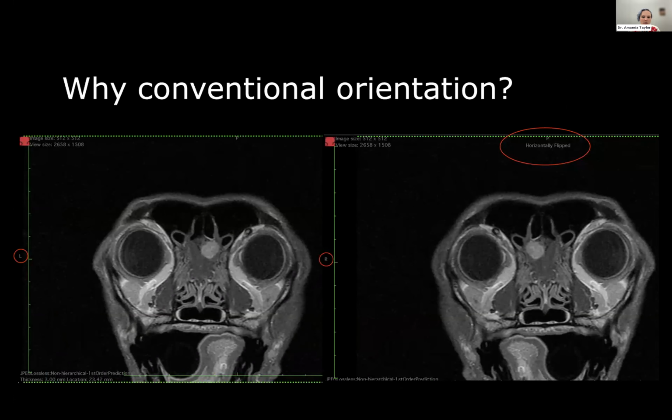This is a dog that presented to a clinic for seizures and had, in a post-ictal state, a dull mentation and some deficits consistent with forebrain disease. It had an MRI and was found to have an extraaxial mass lesion. You'll note here that the lesion is on the right, but these images are not displayed in conventional orientation. So here, this image on the right, we actually are in conventional orientation, and we've got that right-sided extraaxial lesion.